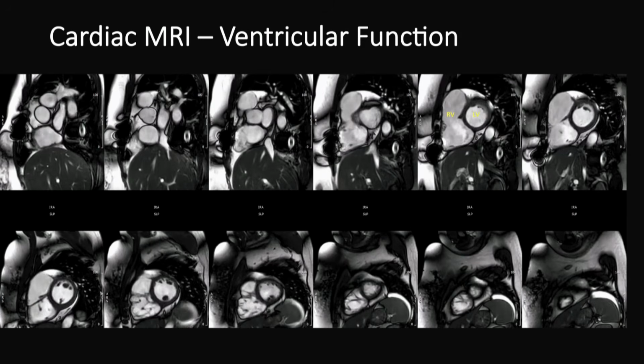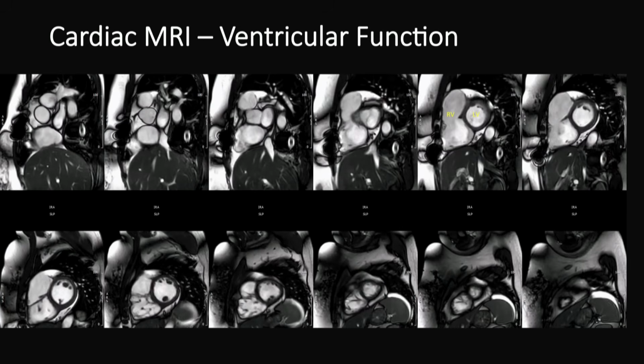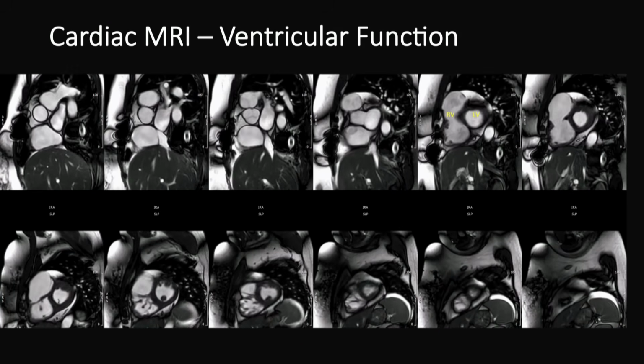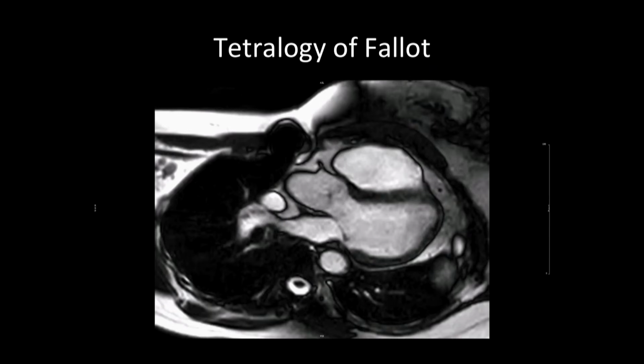In fact, we see dyskinetic movements, and that's patch material. Even if we didn't have the surgical history, we can identify that. The patch will also have gadolinium hyperenhancement, so that's important.